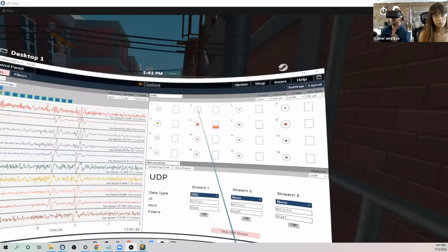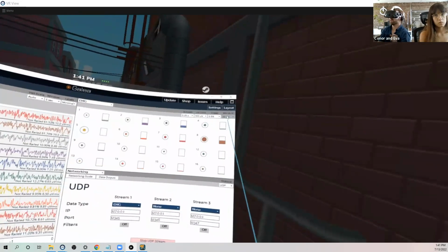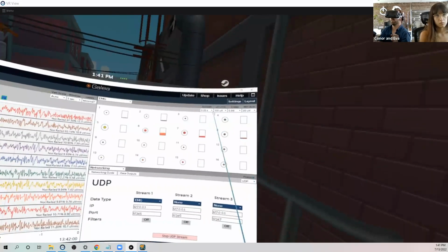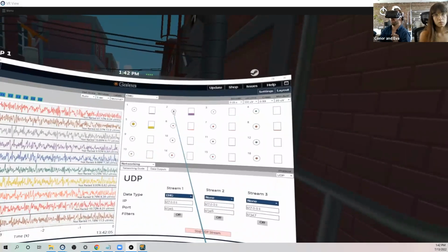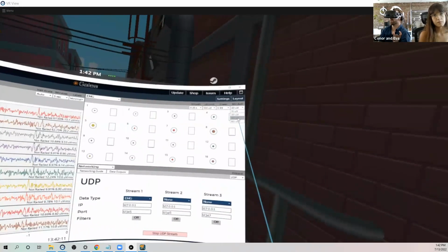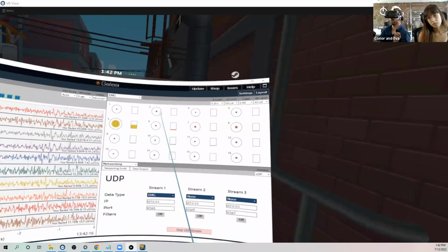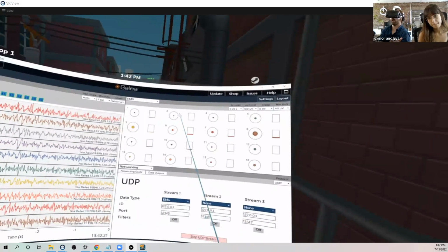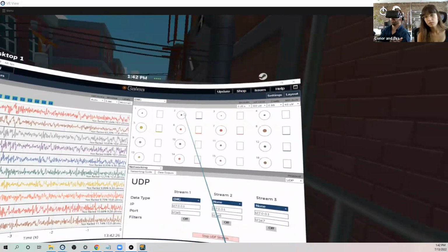If we want to create a larger minimum difference between our upper and lower limits, that's what this one is, the min delta UV. You'll notice that if I increase this value, the outer circle and inner circle that we're looking at as our upper and lower limits will have a larger radius difference. See how the outer circle got farther away from the inner circle? As these two circles creep towards each other, once they hit 40 UV, they won't creep towards each other anymore.